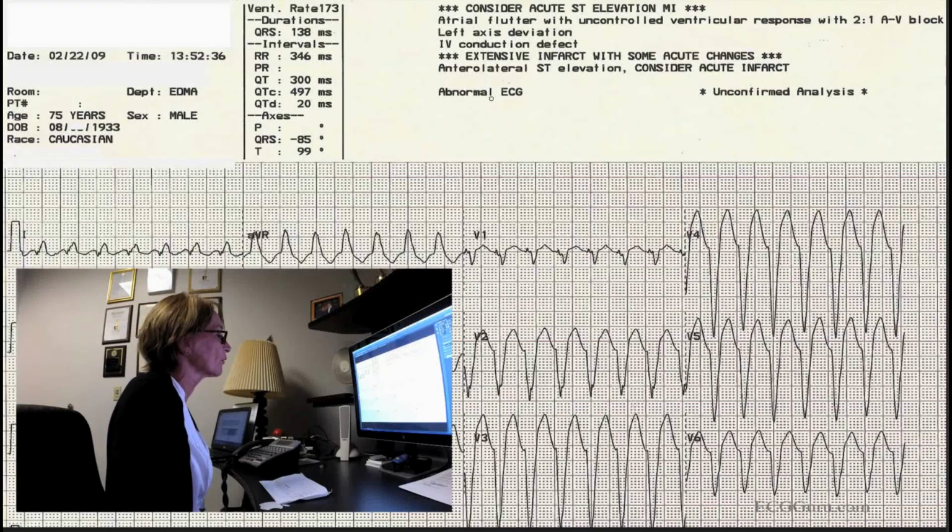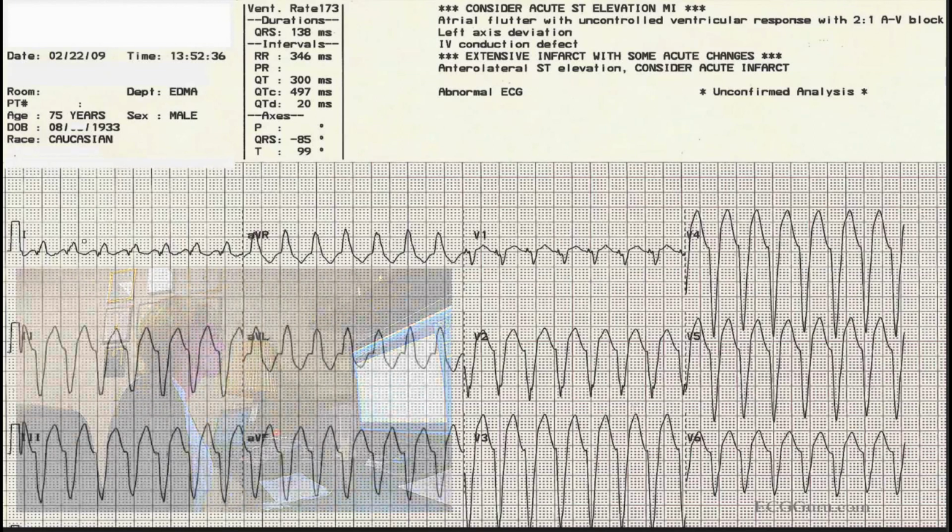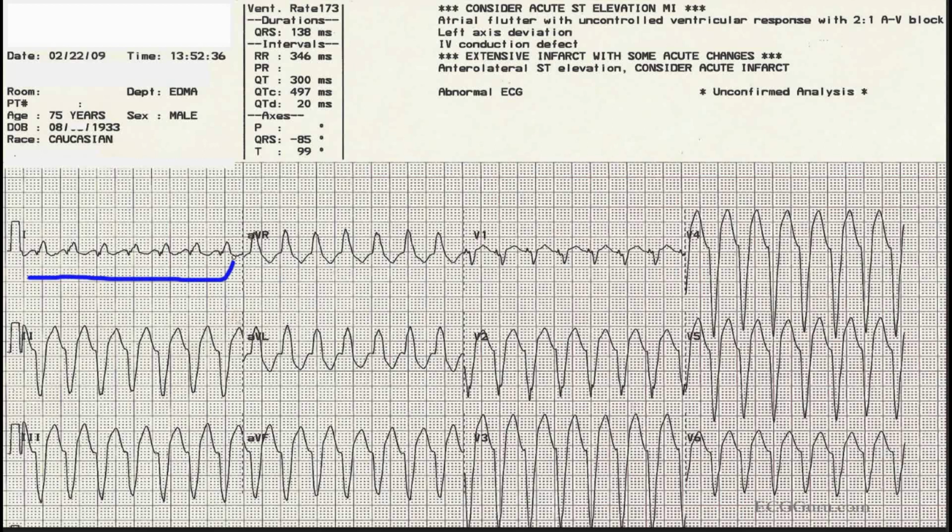Some people feel that if the patient's in a tachycardia, especially if they're a little unstable, they don't have time to do a 12 lead. But your rhythm strip has 2 leads, and that's good to look at, but the more leads, the better. And as evidence of that, I want to show you lead 1 in this patient. If you were just monitoring in lead 1, if that's all you saw, you may not recognize that this is a VTach.